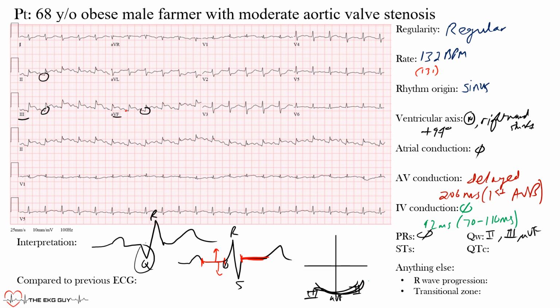Okay, from the end, from the J point or end of our QRS complex, up until the T wave: is it elevated or depressed? This is where we start to see ischemic changes. When you look here, notice that this is elevated. Same thing here. There's J point elevation, and the J point is simply this area here. So it's elevated in those leads, okay?